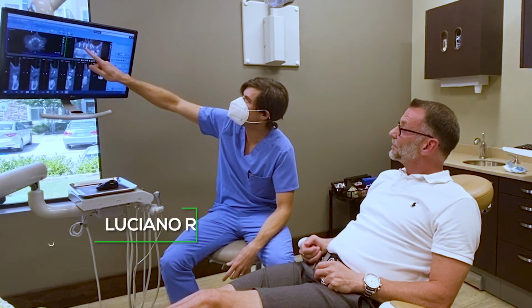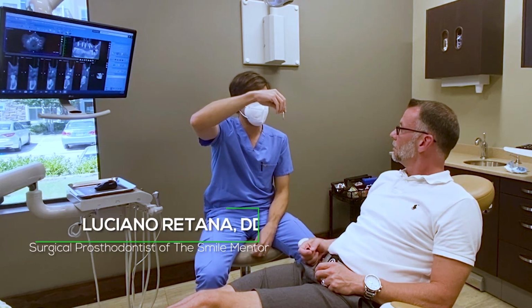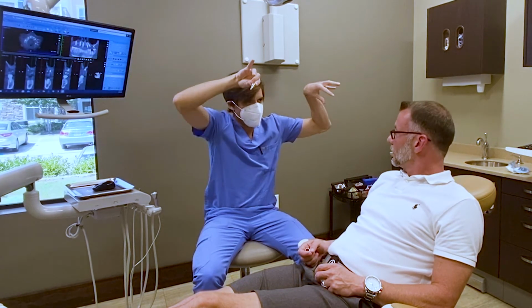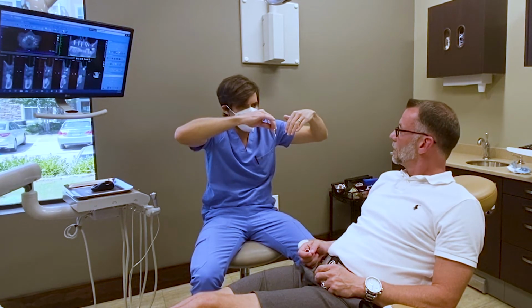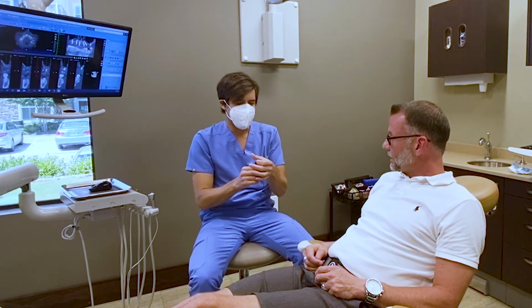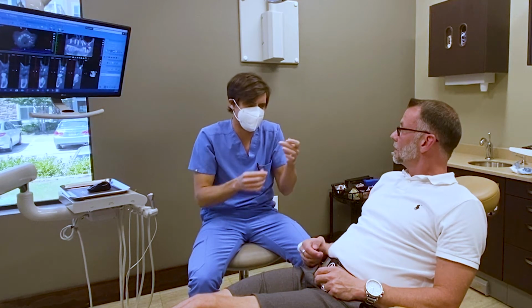So imagine you have these implants. You see the different angulations of the implants. How do you get into that connection with this positive part, the male part, to engage the connections? It's impossible, because if you have this divergent position, you cannot get there. So the multi-unit abutment is going to be a very low profile abutment. This is not a multi-unit, it's different.